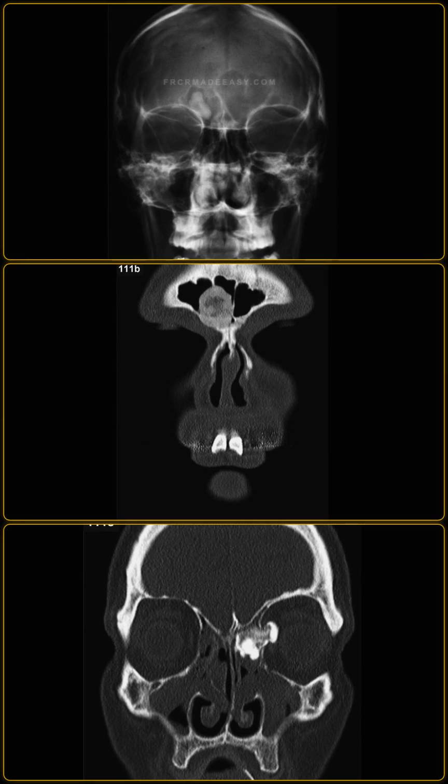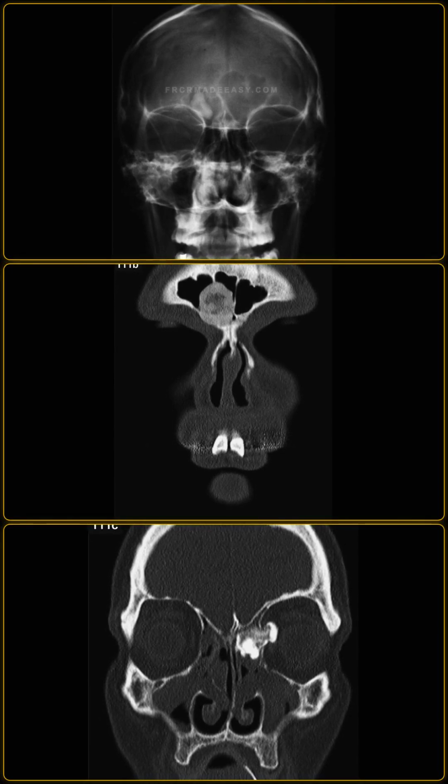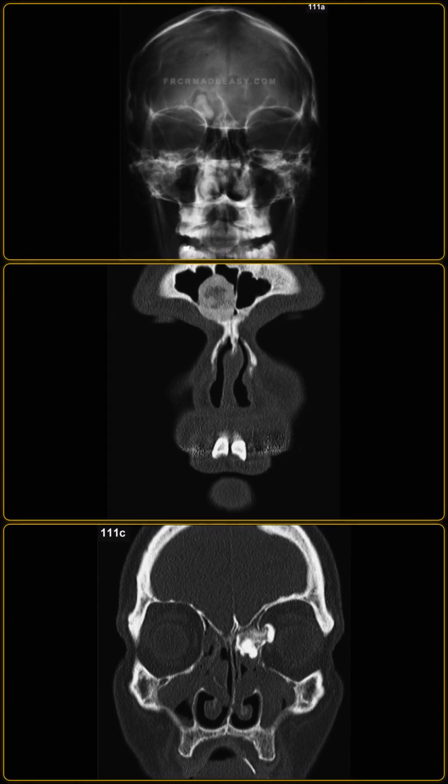If multiple osteomas are identified, I would immediately recommend a clinical workup for Gardner syndrome, including a family history evaluation and referral for colonoscopy. For symptomatic or expanding osteomas extending to the orbit or anterior cranial fossa, I would recommend referral to ENT for surgical resection.